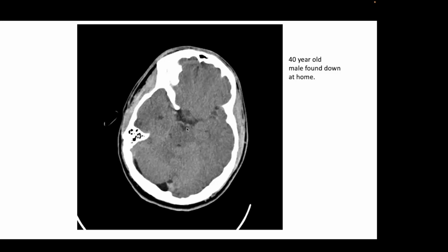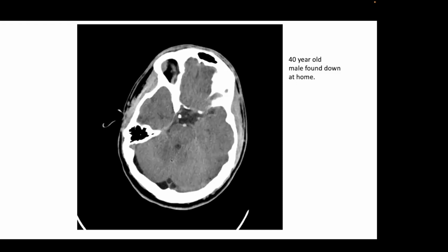When you see this little divot in between, if you think about that V that forms at the apex of the basilar artery, it's going to give you this little divot in the center as the posterior cerebral arteries sweep up. But if we go down from there, you see the way the attenuation changes, as you quite accurately noted. So this is a thrombus in the basilar artery.